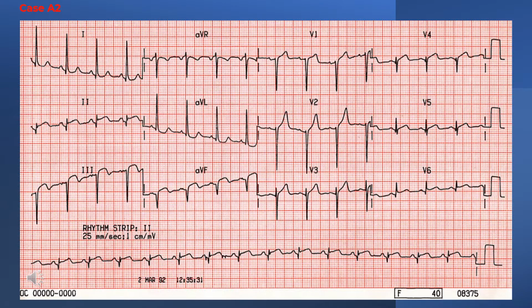The R wave in lead V4 is smaller than the R wave in both V3 and V5, providing clear evidence that there has been loss of R wave in the lateral precordial leads. The ST segments are morphologically abnormal and slightly raised in these lateral precordial leads. The ECG evidence suggests that infarction involves the lateral surface of the heart as well as the inferior surface.